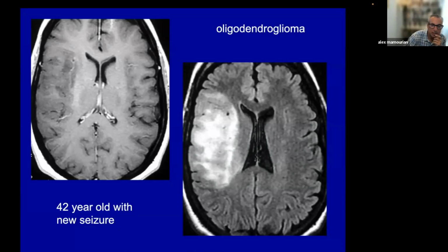Now, how can you distinguish that from an MS lesion? Well, as I say, usually the tumefactive MS cases have some quality of peripheral enhancement unless they've already been pretreated with steroids. But again, you could argue that in some ways it resembles an MS lesion because there is a lesion that's much larger than you would expect for the amount of mass effect on the ventricle. And we're not 100% sure about the cortical involvement here. But as I say, in this case, the absence of enhancement does argue against the notion that this would be tumefactive MS. You could step back from the case and say, I don't know if I could feel comfortable making that diagnosis on this one scan.